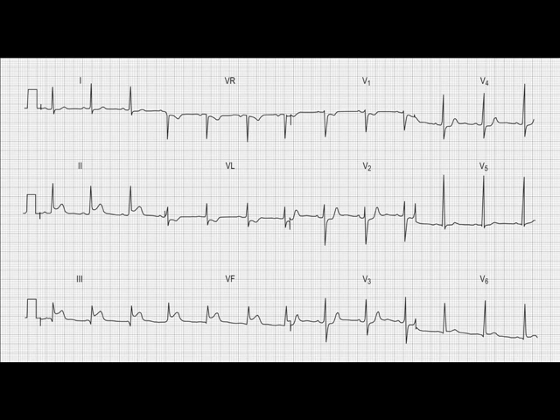So now you've been champing at the bit for me to look at the abnormality, and certainly if you look at leads 2, 3 and aVF, you're seeing a blurring of the QRS complex with the T wave. That's the ST segment, it's elevated. And many of you watching and listening will know, with a good clinical history and with biochemical markers such as troponins, that is indicative of a myocardial infarction.